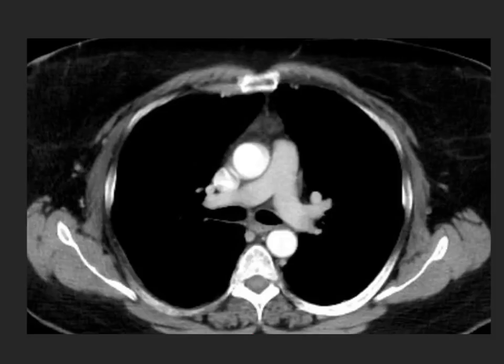So what are some common Hounsfield unit values of soft tissues that we might see on a CT scan of the thorax? If we drew a region of interest on fat, for example, that's going to be around -100 Hounsfield units. If we drew it on air in the lung, that's going to be around -800 Hounsfield units. This is a contrast-enhanced CT scan. If we look on muscle, this is probably going to be around 40 to 60 Hounsfield units. If we looked at the density of this intense contrast that's sitting in the aorta here, this is going to be probably 100 to 200 Hounsfield units.